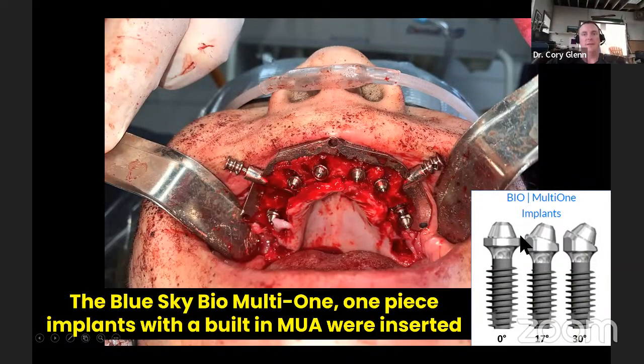So you can actually save a good bit of money because you're not buying independent parts. You know, you're not buying the implant and then the multi, it's your implant and your multis all in one. And the only thing you need to be careful of with these long range is that you don't want to strip the screw that goes into the top of the multi here. So just be mindful as you're placing those, if it feels like it's cross threaded and you're continuing to screw in, you might end up screwing up your threading. It ought to go in nice and passive, like any screw should go in. But aside from that, I see no downside to these things. And they really are stronger and they can save you a lot of money. Plus you don't have an implant to abutment interface, and you know that's better for bone health.